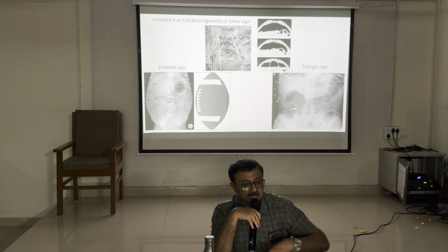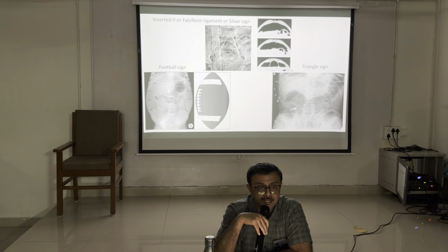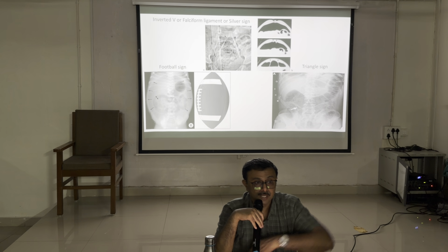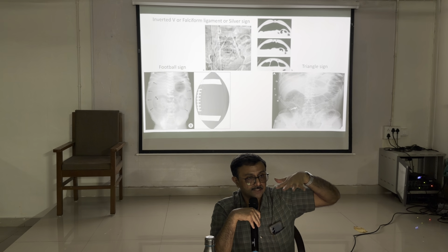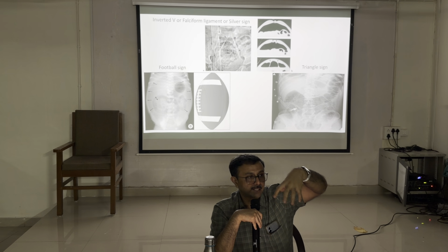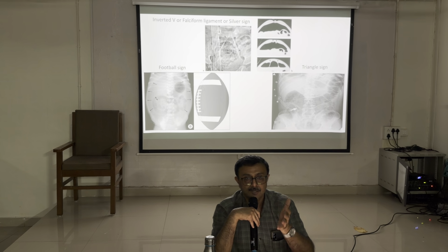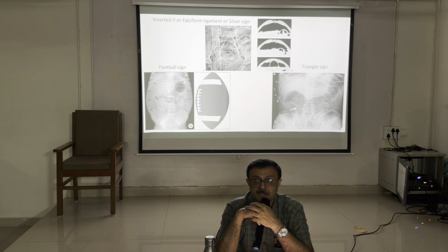See here the black arrows. What do they show? Gray is the delineation. The whole peritoneum is gray, so gas is distributed through the whole peritoneum. In supine position, gas is distributed in the whole abdomen and peritoneum. Gas-filled bowel is settled centrally, floating bowel. If this kind of picture is there, it is football sign, just like an American football.